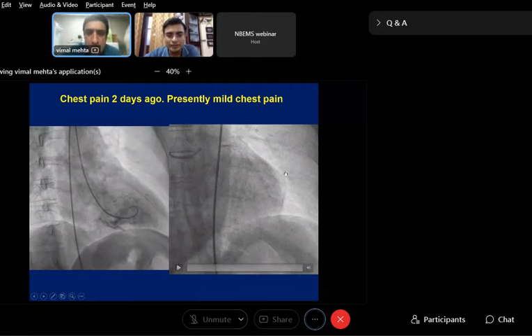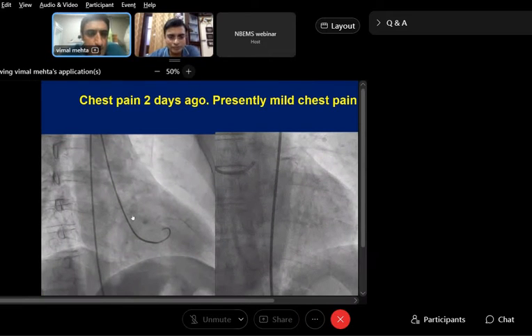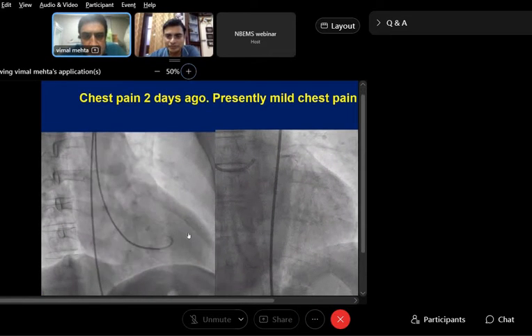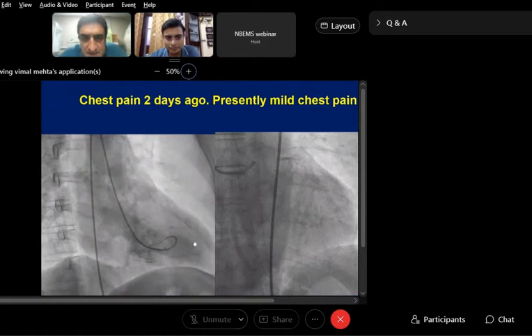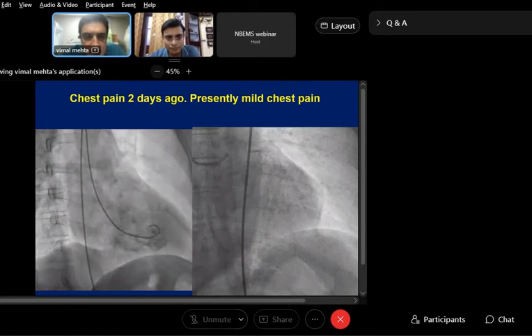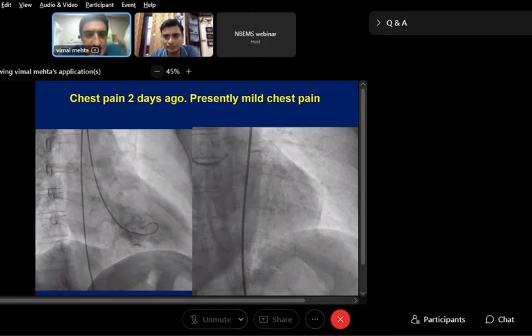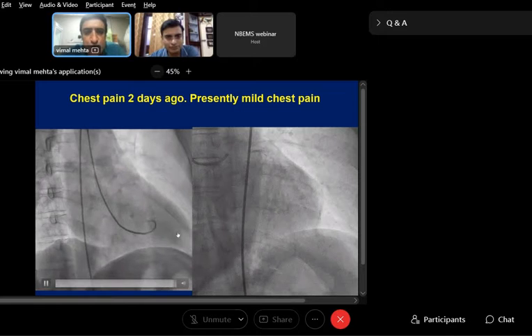So there is no aneurysm. See, it is okay to give wrong answers. No problem with that. See, the apex is, actually perhaps many a time what happens is, if the injector is not working, sometimes we give a hand injection, not a great practice, but nevertheless, the LAD territory is moving very well.